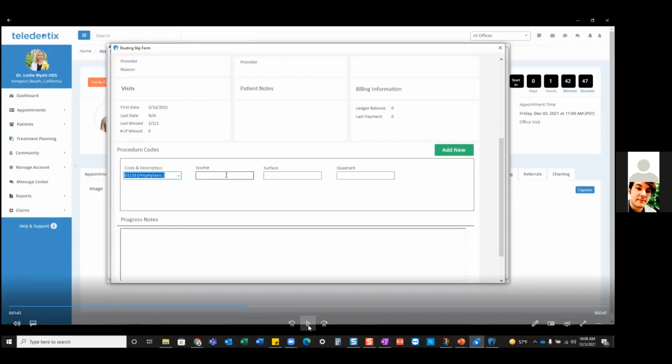So here, not only are we giving you the accessibility to a routing slip, but it's interactive, guys. This is on another level in terms of what you're going to be able to do without having to print anything, without having to write anything down, without having to carry paper with you and have a record that can be lost or misplaced. Everything is in one place. And even better, when I'm back online, I'm good to go. I can go ahead and sync all of the information that I'm entering right here and rest assured that it's going to show up in my patient's chart. So just really excited here.